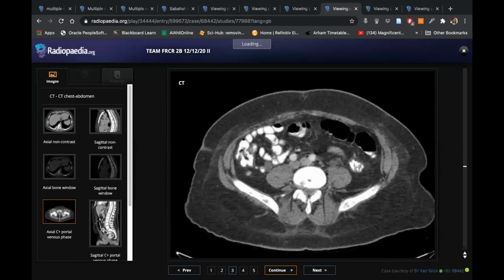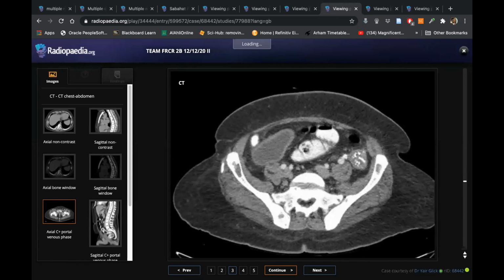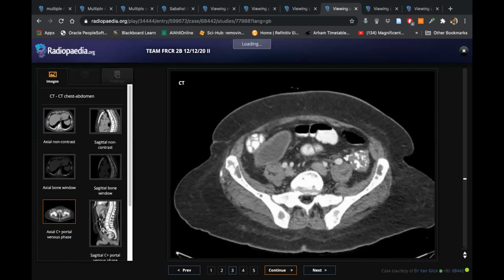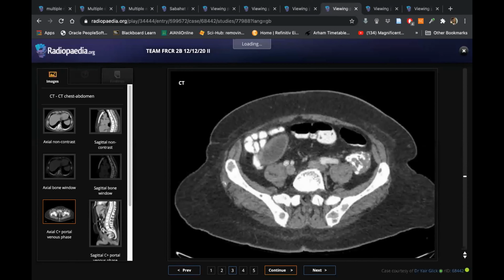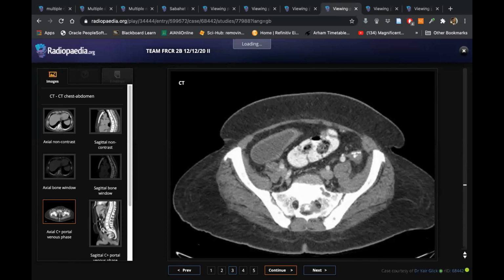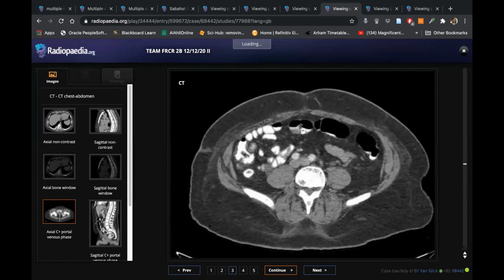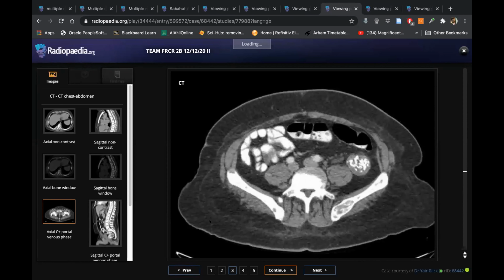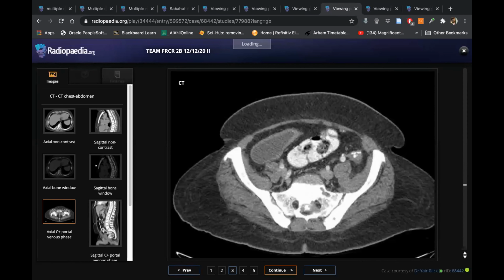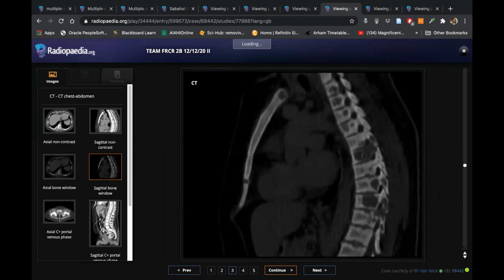Okay, so this is? This could be extramedullary hematopoiesis, something like that. Okay. I can't make it. The rest are the brown tumors and multiple osseous lesions. When I said I'm not giving you the history of transplant, it doesn't mean I'm not providing you with one. But what do you think it can be in end-stage renal disease? This is a calcified transplant. You are right, huh? Even if somebody gives you a plain film with end-stage renal disease, that's what you should say first, okay?